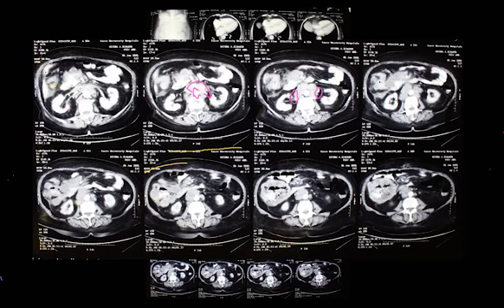Okay, what about the cava? Can you see the cava? The trick is you should always look at other images. Is the cava present or not? Look at another image.